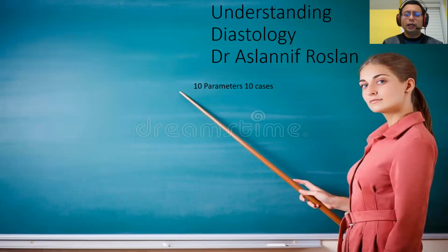So we have what I call 10 parameters and 10 cases. I will give you 10 cases, and I hope you can stay with me until the end of the 10 cases. And I also wanted you to remember these 10 parameters, okay? I know it's a lot, but try to remember these 10 parameters.